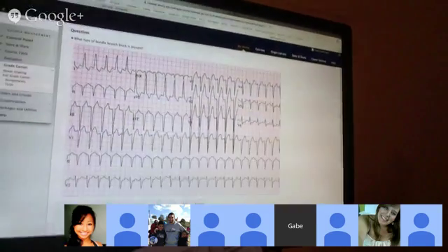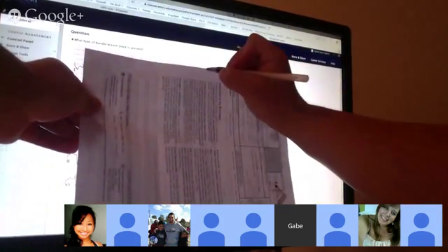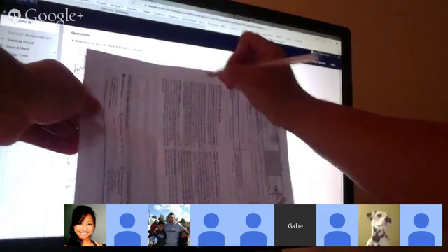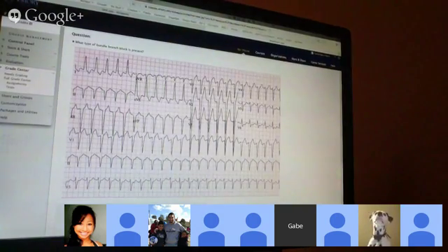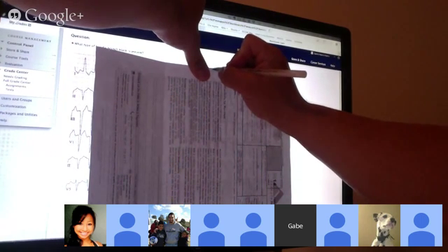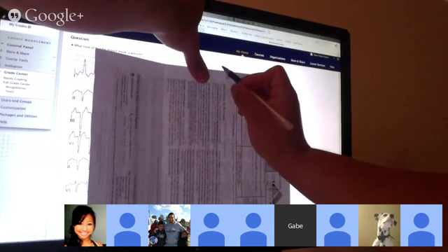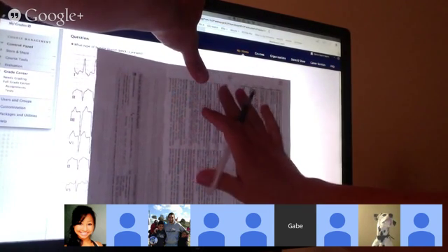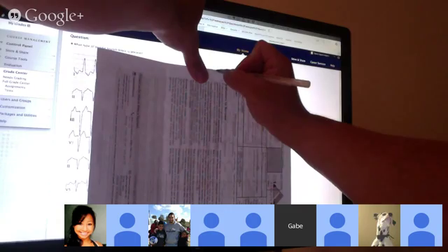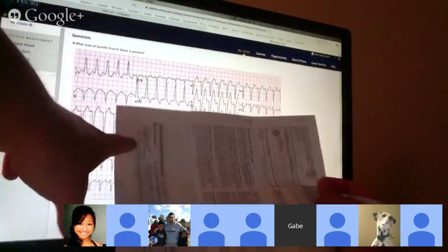All right, so if you're looking at it, the best thing to do is draw yourself what is exactly one. Hold on. No. Draw yourself one box. Can you guys see me doing this? Yeah. So I'm drawing one box here. And now I'm going to say, okay, if it's greater than half of this, we know it's pretty close to 3 boxes. There's only 5 boxes in a big box.